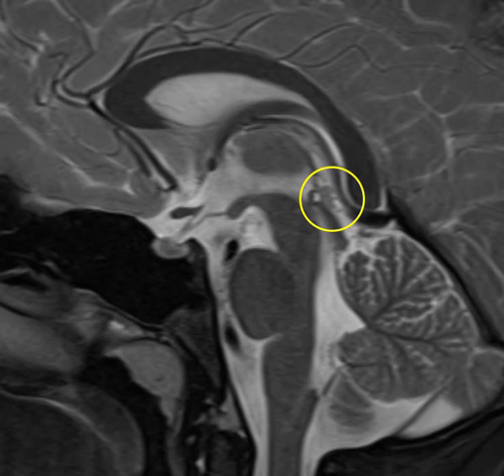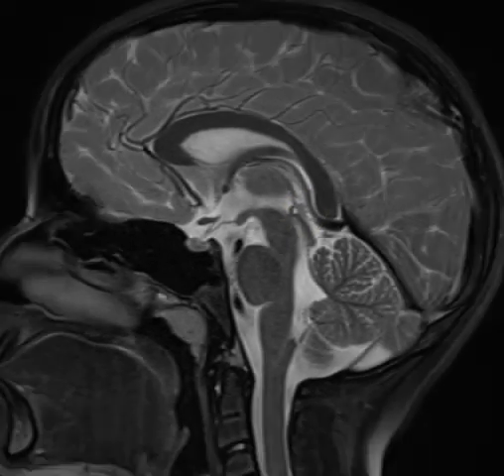It's located just posterior to the posterior commissure and adjacent to the superior colliculi, and along the backside are the internal cerebral veins and the splenium of the corpus callosum. It's a fairly common site to develop a cyst that, when large, can compress on the superior aspect of the tectal plate and give you something called Parinaud syndrome. It's a paralysis of upward gaze.